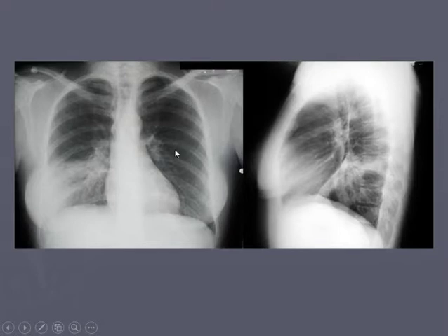Looking at this one over here, airway looks fine. We have a good carina, B, bones, 1, 2, 3, 4, 5, 6, 7, 8, 9. We're good there. Good cardiac shape, pulmonary artery here, pulmonary artery there, 20-degree angle. Diaphragms, can't really see the costophrenic angle there, but we do have large pendulous breasts. We do see a costophrenic angle there. Saying that, looking at the lateral view, costophrenic angle here, costophrenic angle there, both of those are sharp, so that's how you can determine the absence of pleural effusions on a lateral angle where you couldn't see it on the PA view.